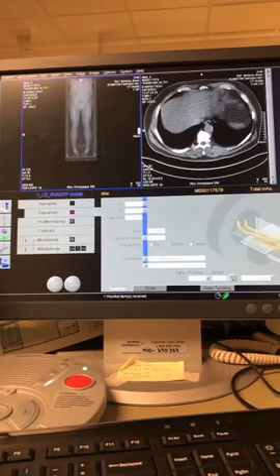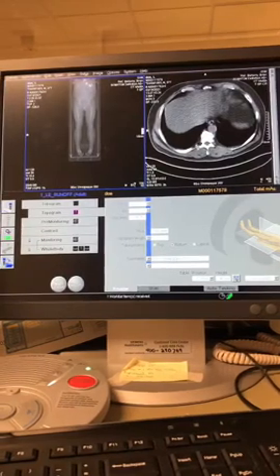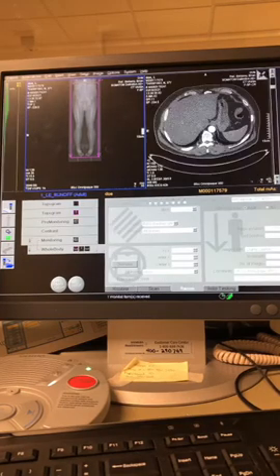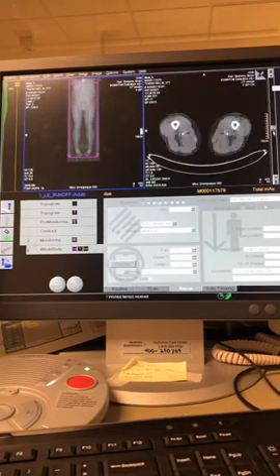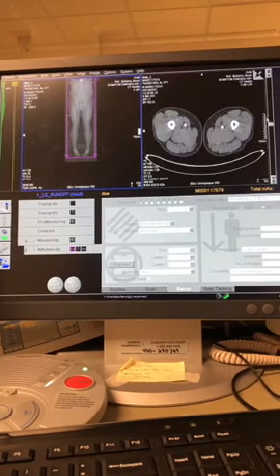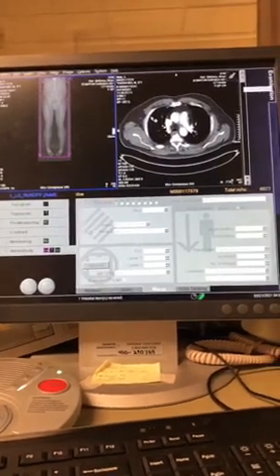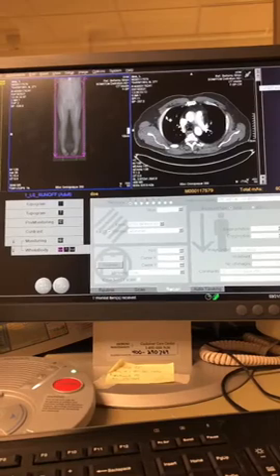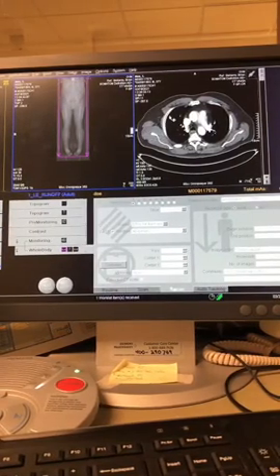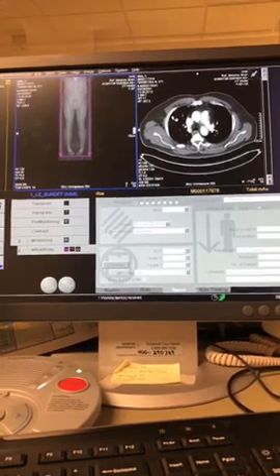But the fundamentals of this are the same, because this is an aortic angiogram, except it's a runoff. So this one's scanning from the aorta through the toes, which is insane. So we're gonna go aorta to toes and look at all the vessels in between, which is a pretty cool scan. And the fundamentals of the scan are the same as the chest. But like I said, these aren't as common, right? Most thoracic or aortic dissections just aren't as common as a PE or a pneumonia or a cancer, okay?